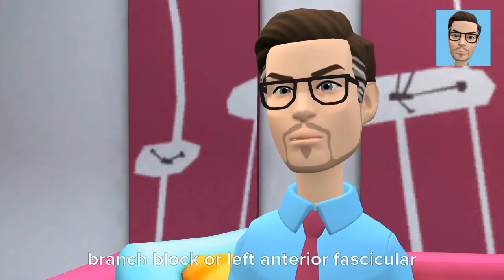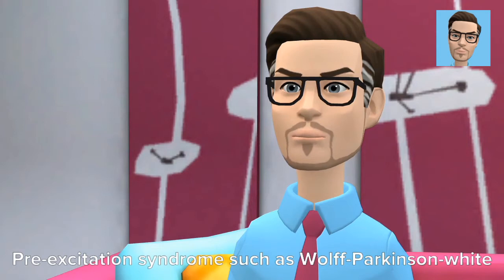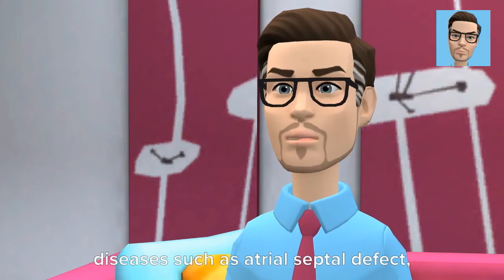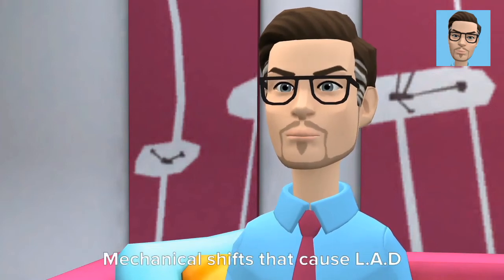Conduction defects such as left bundle branch block or left anterior fascicular block can cause LAD on the E.C.G. Pre-excitation syndrome such as Wolff-Parkinson-White syndrome as well as congenital heart diseases such as atrial septal defect and endocardial cushion defects can also cause LAD on E.C.G.